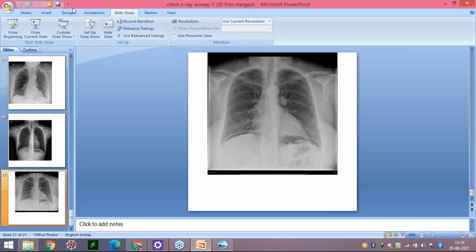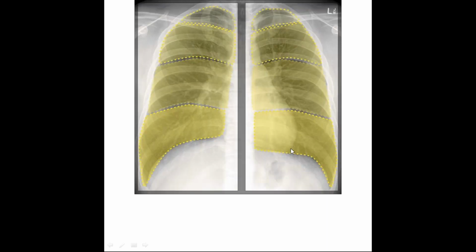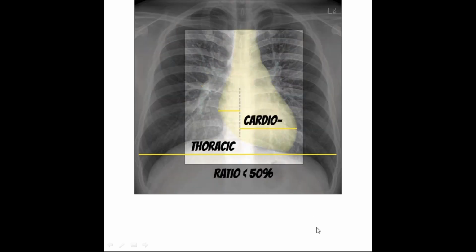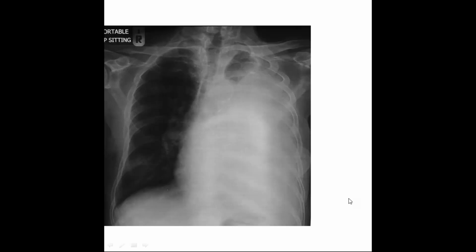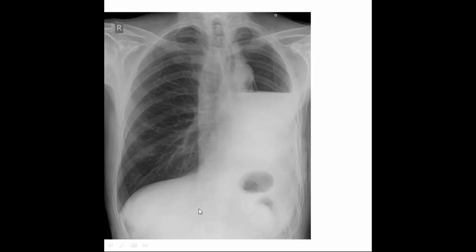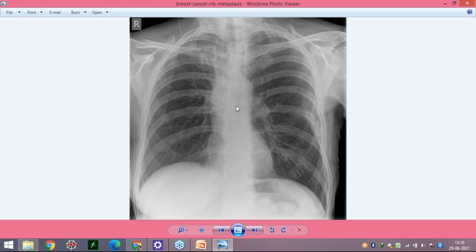In pneumomediastinum, you will find a thin streak of air here, like here. That is what a pneumomediastinum would be like. Okay, so now I don't want you to. We did have an X-ray of cardiomegaly with heart failure.